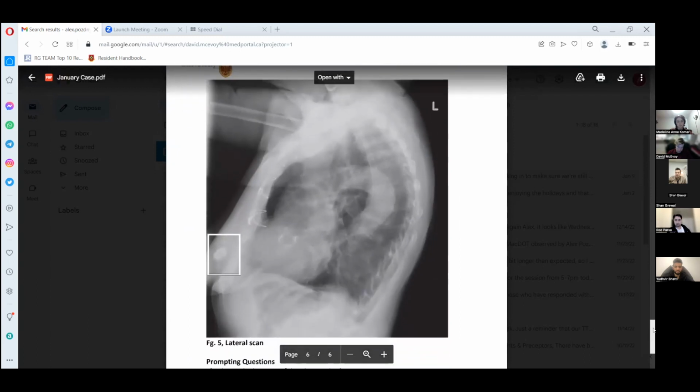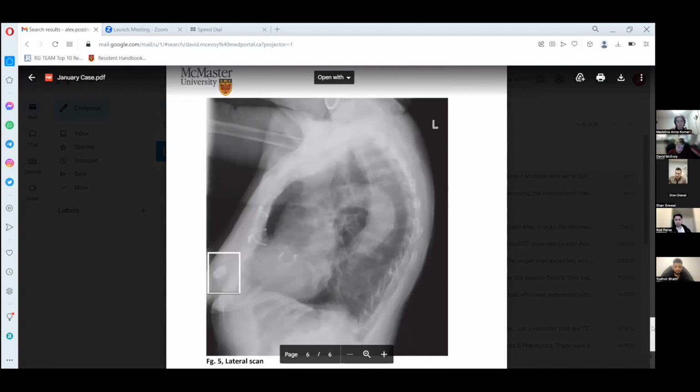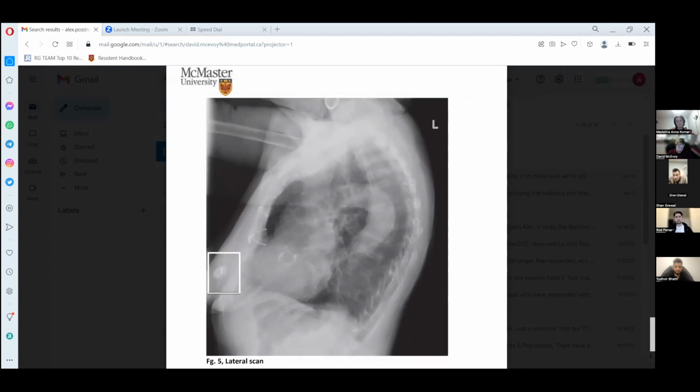And as we can see, it turns out to be not quite in the lungs. It actually turns out to be in the breast tissue. So this certainly could be more along the line of a breast lesion. And it looks like it's quite dense. And usually what gives you density in soft tissue is calcifications. So this looks like a very calcified nodule or a mass in the breast.